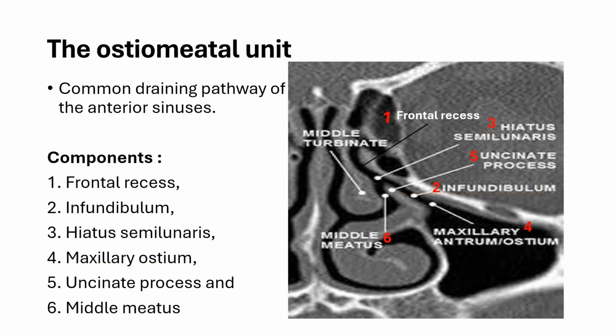The osteomeatal unit is the common drainage pathway of the anterior sinuses, that is the frontal, maxillary and anterior ethmoid sinuses, and it is also called the osteomeatal complex.